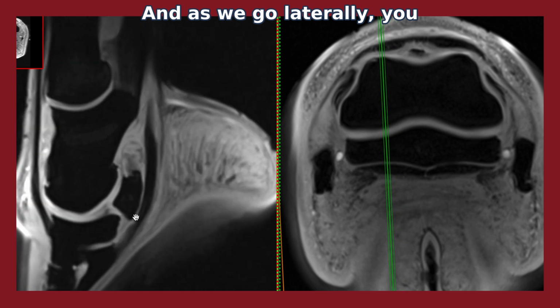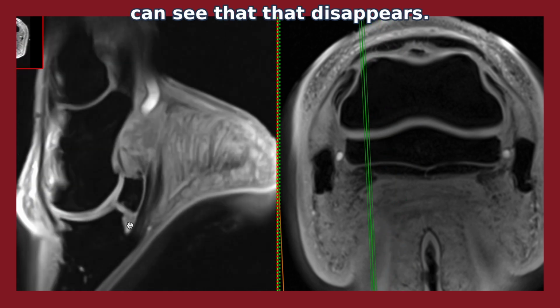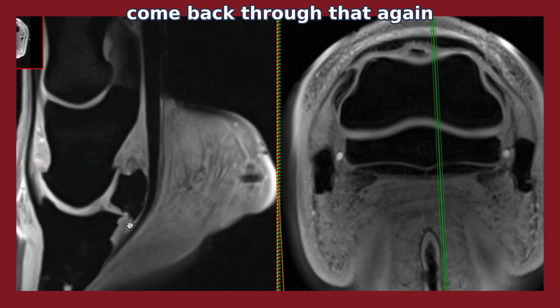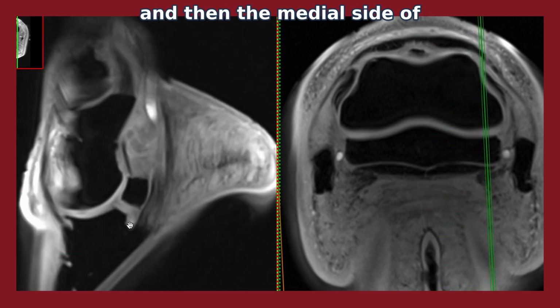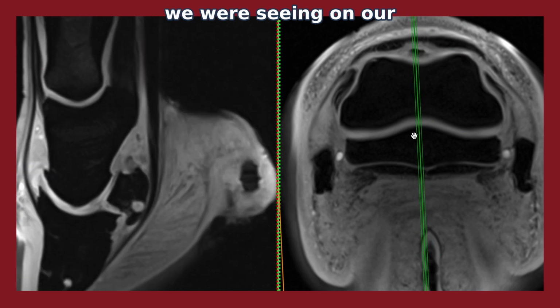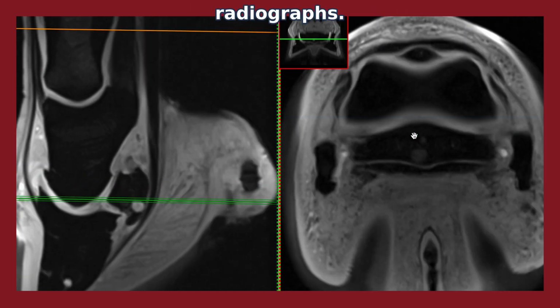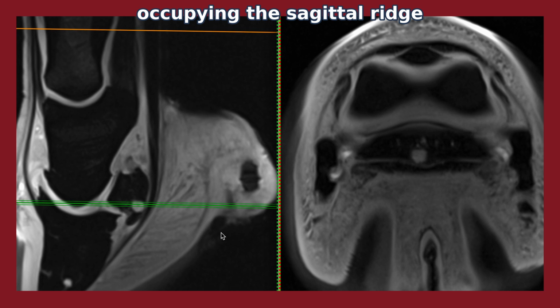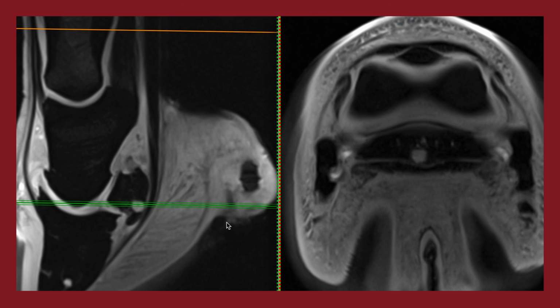As we go laterally, you can see that that disappears. As we go medially, we come back through that again, and then the medial side of the bone is entirely normal. So this is the lesion that we were seeing on our radiographs. If we look at that in the transverse section, we can see that it is just occupying the sagittal ridge of the bone, very much like we were seeing in our navicular skyline radiograph.